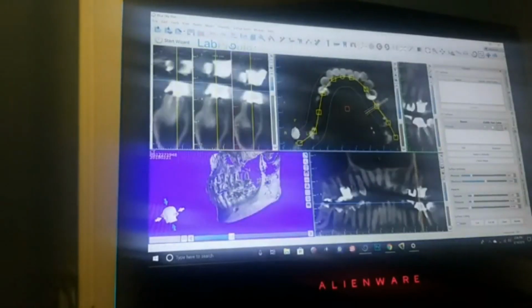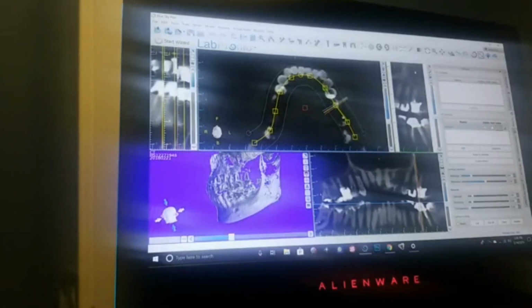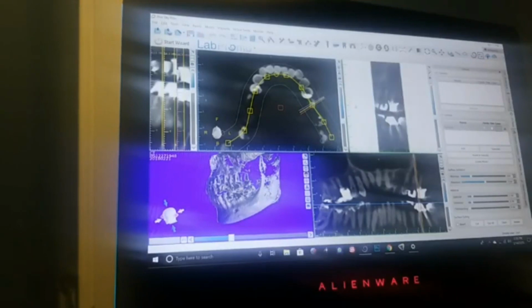Okay, now let's move forward. So now we have all the images down packed. Now, what is this image down here? Let me just close this a little bit. Now we have another image that's lingering on this area. I'm pointing out the upper right image.